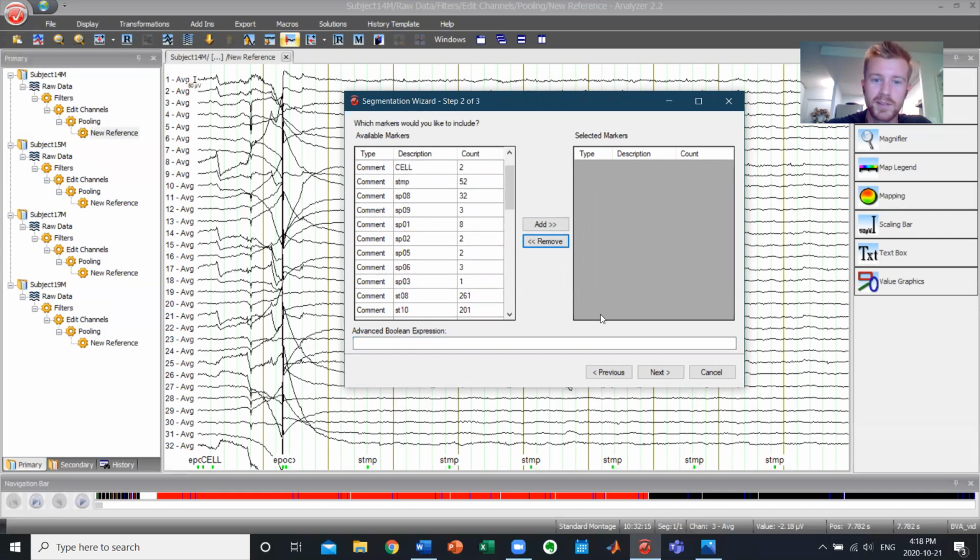Maybe it was SP. Actually, I have it written here. So for the go condition, it's STO2 and SBO2. So these are the two that I'm looking at. STO2 and SBO2. Perfect. And now, these are the markers that I'm telling BVA to look for down here.